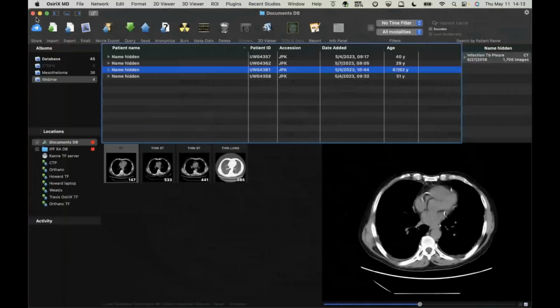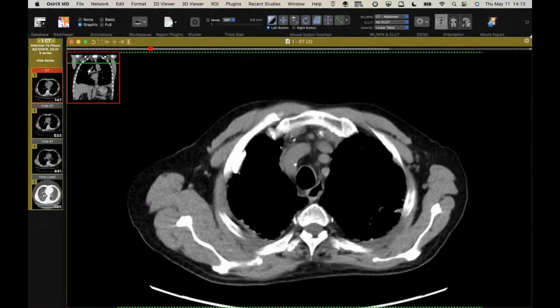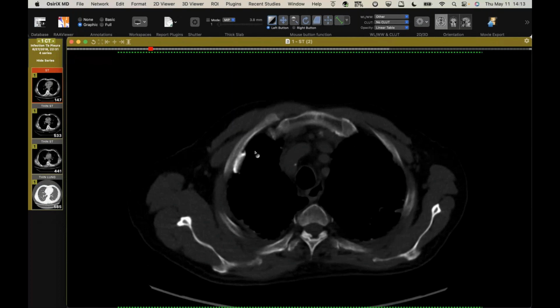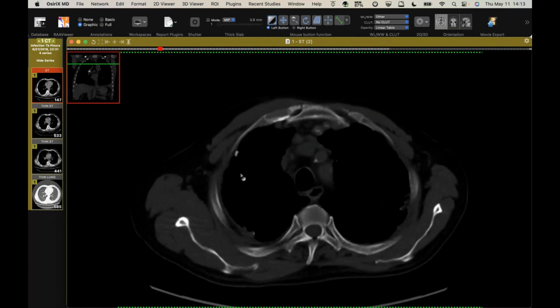And then the other thing, do you think that's really a pleural plaque or do you think that's a pseudoplaque? I think it's a real plaque. Let me show you. If you look at that, it's got that mesa edge. It's got true calcium. It's not like little clustered nodules. That is a real plaque.